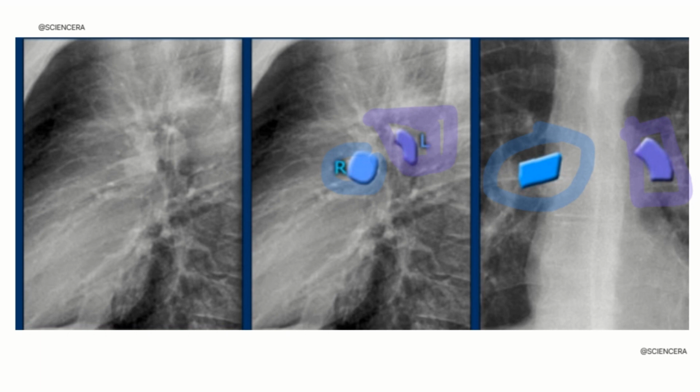This means there is a problem around where the pulmonary vessels enter the lungs, but they are not sure if it is because the blood vessels are swollen or if there are enlarged lymph nodes. When they look at the side view of the X-ray, they see a round shape where there shouldn't be any blood vessels. This tells them that the problem is likely enlarged lymph nodes, not just swollen blood vessels.